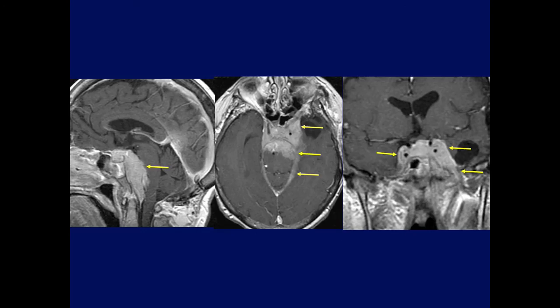And here's a larger one. They get progressively larger. A large upper clival meningioma. Notice the encased carotid artery. Again, notice how the free edge of the tentorium is thickened and enhancing because of the tumor spread.